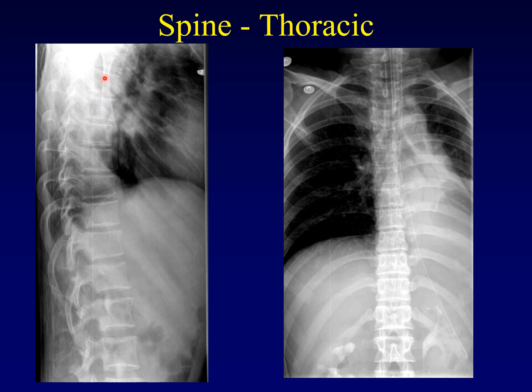This is normal in the thoracic spine, and it is called thoracic kyphosis, the normal thoracic kyphosis. The cup configuration in the frontal projection is no longer seen. Now the vertebral bodies look like rectangles when they are seen in this projection. They're actually cylinders, but when you look at these cylinders from the side, they look as though they were rectangles. When we get to CT, we'll get to see those cylinders looking a little more circular.